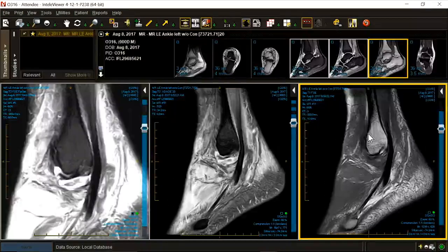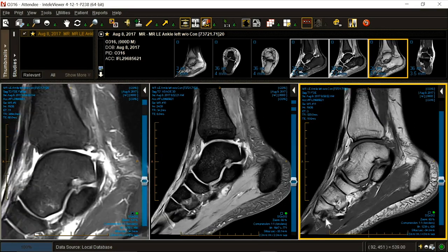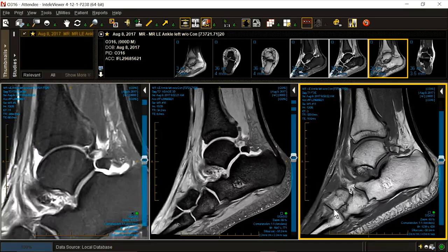We're getting sagittal, sophisticated. Peroneus brevis and longus. Brevis, good. Longus goes into the cuboid tunnel. Good. Goes over to the medial side of the foot. We can track it. Compartment 2, there are 2. Compartment 1, there is 1.